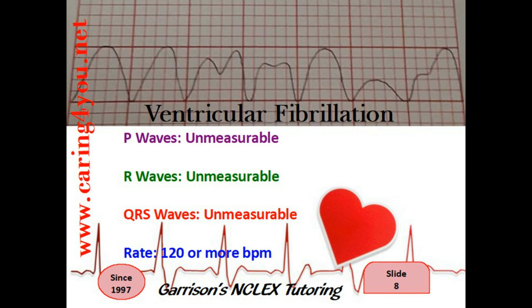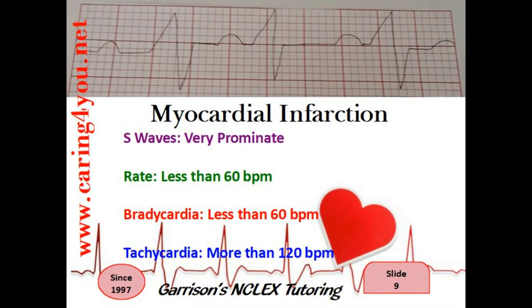And we got one more to learn. That's it. This is exciting. All right, good job, people. Let's keep moving on to the next slide. Okay, now the last strip we gotta memorize for the NCLEX. Dun, dun, dun, dun, dun. Oh, well, it wouldn't be a happy tune like this if it actually happened to you. So maybe that was inappropriate. But myocardial infarction. Let's look at myocardial infarction and how would I explain that?